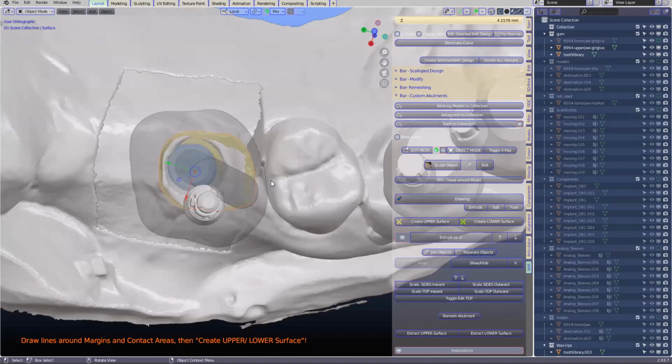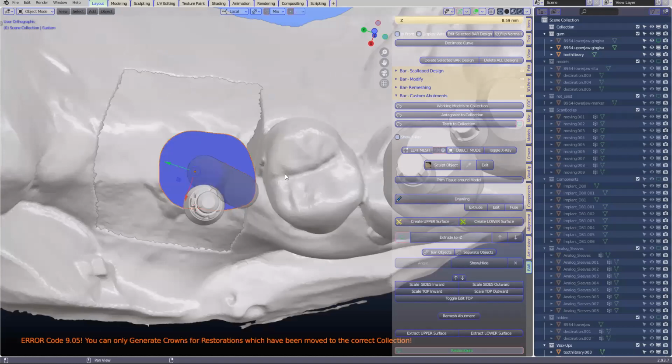All right, in your direction of view. So this is going to extrude the yellow surface upwards. Isn't that correct? Towards me, exactly like when we're making the dies and the model design and it extrudes away from you. This extrudes towards you. Okay, so we're going to extrude it towards me. Okay, now this is what it's created.